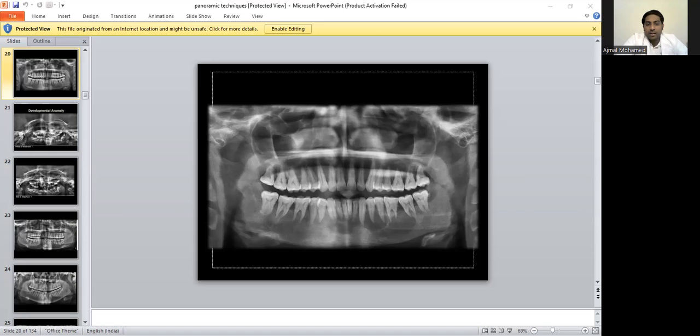Now you see this is the lateral section, this is the frontal section, and this is another lateral section. Each section is scanned at a time. First a lateral section is scanned, then the frontal section, and again a lateral section. Then they combine all the sections together, and slowly the image comes together like this. This is the concept of tomography.